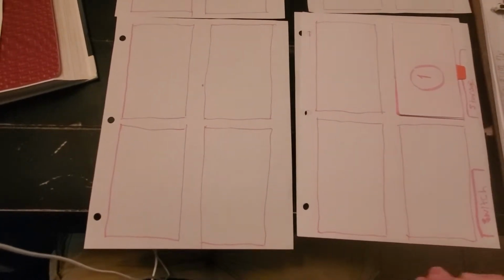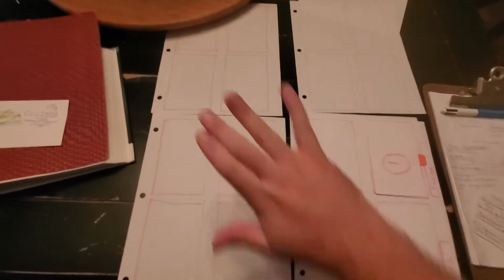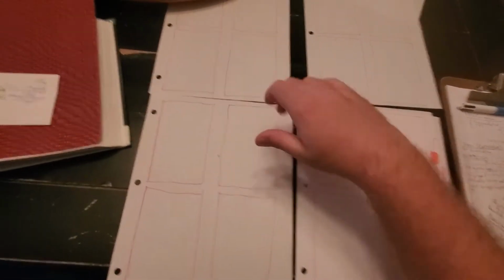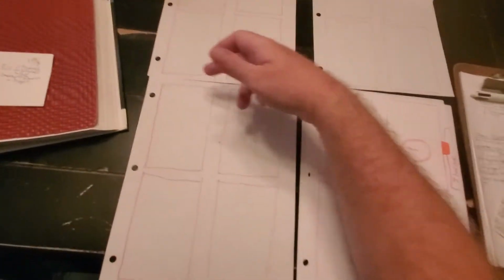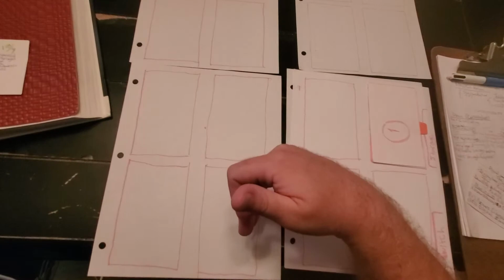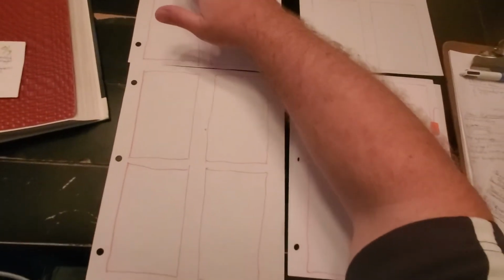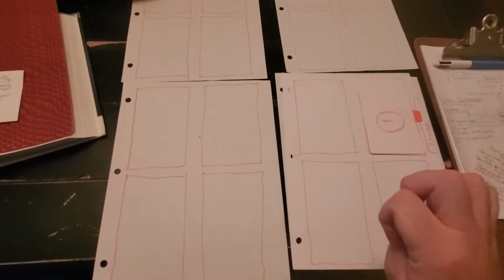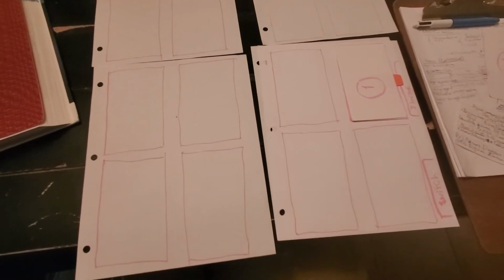Basically, the field of view is, what are you looking at? If your arm is hitting some cells, and these ones are on, but these ones are off, and these ones are on with your arm, then it's going to give you a geometric shape.